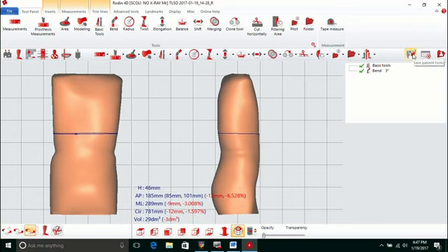Up here in the upper right, there's a little floppy disk looking thing. That's the save button. There's also in Neo, it'll save every 20 seconds. So if the computer does crash or Rodin freezes up, it will have a backup model when you restart the software.